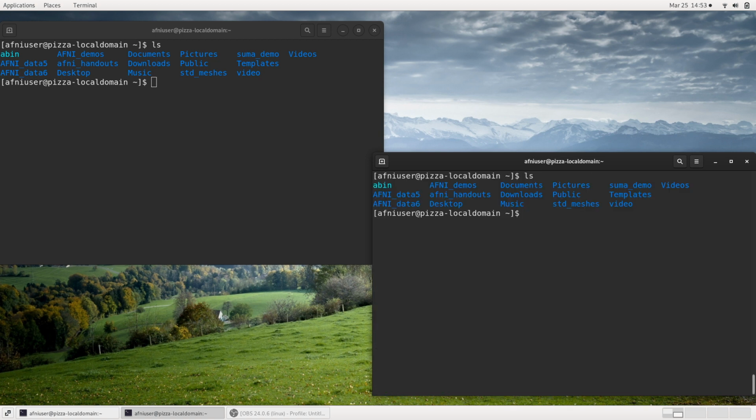And I will just open it using afni_open, which is an AFNI program that looks through the directories in your path to find certain viewing functions for PDFs. So in my case, it'll probably use Preview on a Mac. It'll work similar to just the open command. But anyway, so we can all use the same one, I'll say afni_open, AFNI handouts, AFNI 05 regression.pdf.